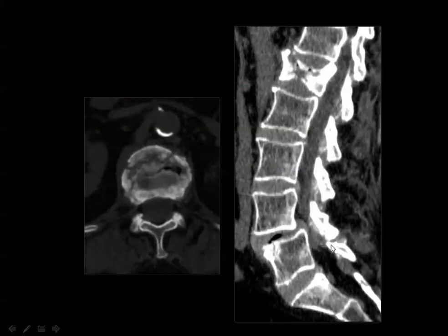And in this type of fracture, you can see compression fracture of this is L5, L4, L3, L2, and this is L1 vertebral body with depression of the superior and inferior end plates. There is mild posterior subluxation of the vertebral body encroaching on the spinal canal. The axial image shows comminution of the vertebral body with no evidence of bone fragments inside the spinal canal. Also in this patient you can see first degree spondylolisthesis of L4 over L5 with vacuum phenomena in the intervertebral disc space.